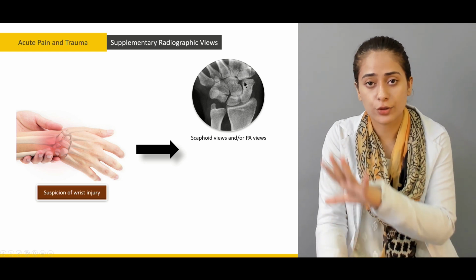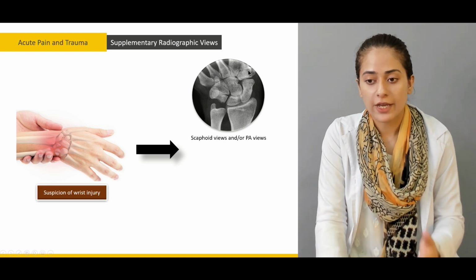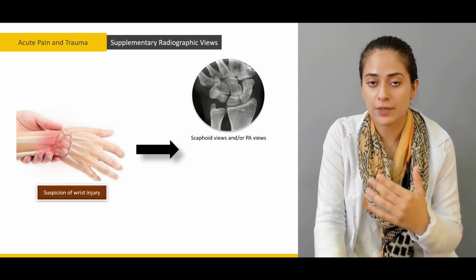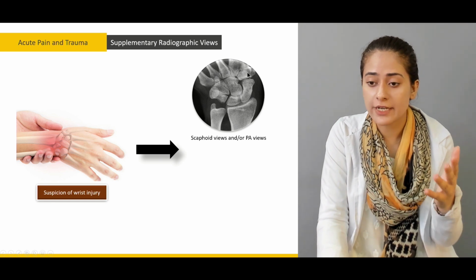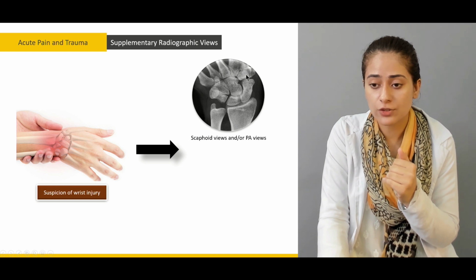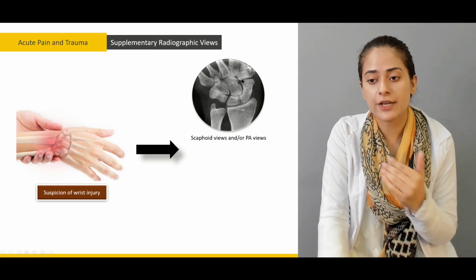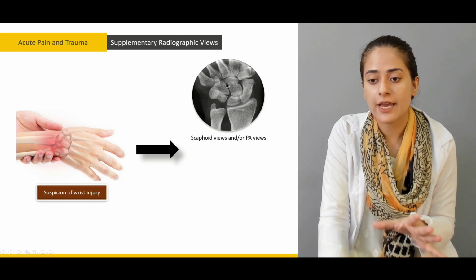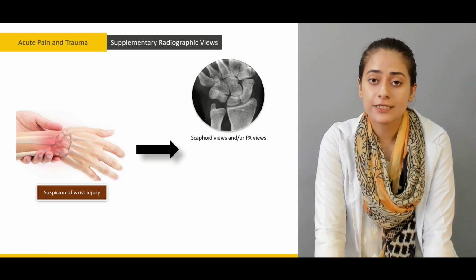So we're going to move from lateral to medial again. So the first upper lateral carpal bone is trapezium, and then we have trapezoid. So TM, and after that TD. So these two here, and then we have capitate, which is try to catch her. So this is capitate, C catch, and C for capitate, and then hamate. So that is all for the 8 carpal bones.